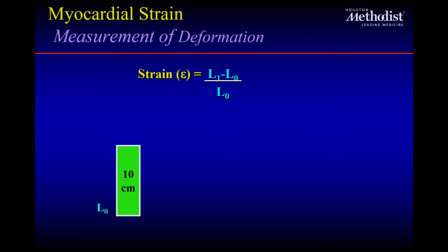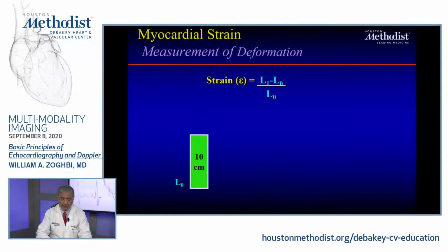And part of the major advantage of this speckle tracking is the ability to look at deformation, not only in the usual way in the past that we used to take a look at, which is thickening of the myocardium from the parasternal long axis where you're perpendicular to the structure. Here you could look at deformation and thickening and thinning in almost any window.